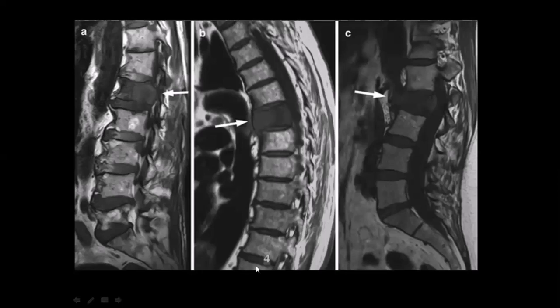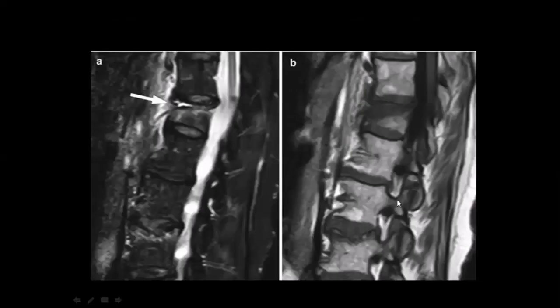Any answer, it will be malignant. Why malignant? As we mentioned, this is the posterior cortical bulging. Yes, exactly, Dr. Marwa and Dr. Ala. The bulging in general goes with malignancy, and also the soft tissue component.